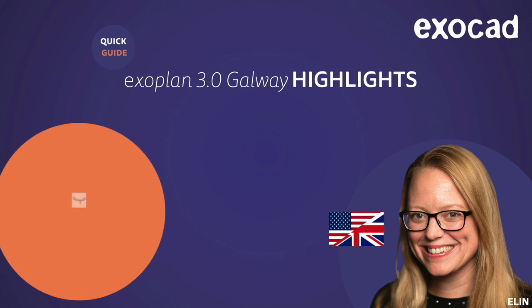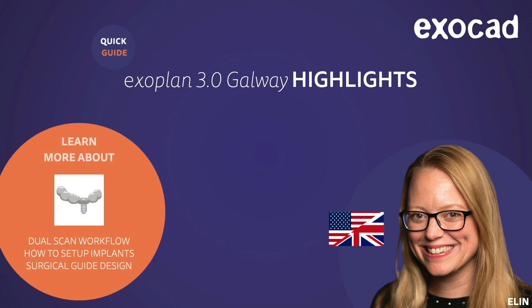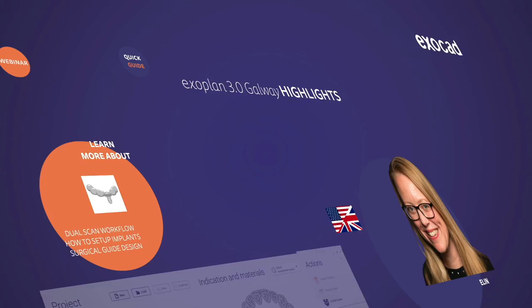In this Exoplan tutorial, I will show you the new features in our Exoplan 3.0 Galway release for both the implant planning part and the Guide Creator module.